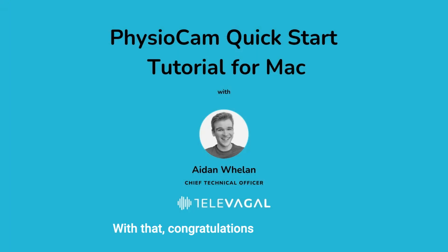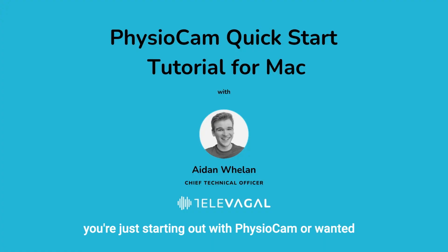With that, congratulations on completing your setup of PhysioCam for Mac. I hope you found this video guide helpful, whether you're just starting out with PhysioCam or wanted a quick reminder about how to get everything set up.